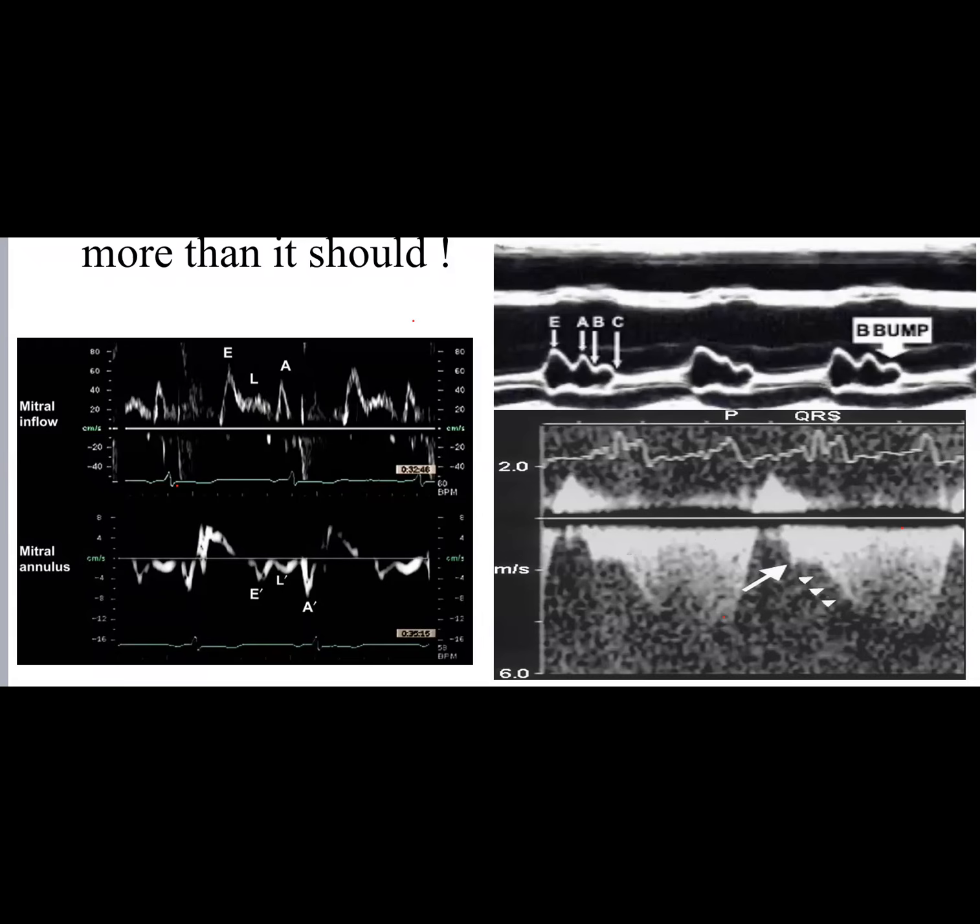So did you notice one thing that brings all these things together? That the mitral valve is strongly kept open when it should not be. Meaning between the E and A the valve closes. So during this time we don't have flow. Now because of diastolic dysfunction the valve opens forcibly and we have a flow.